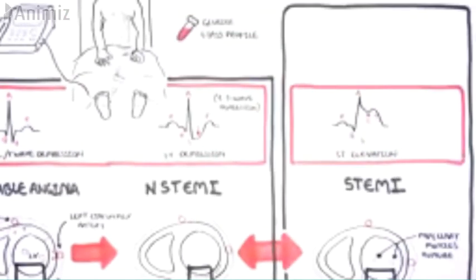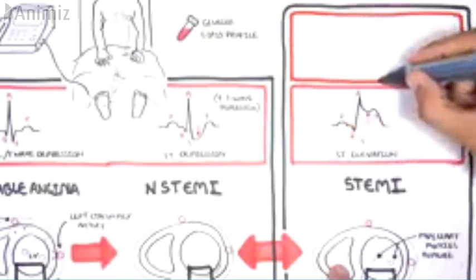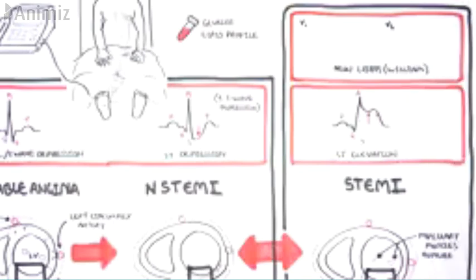With a transmural infarction, it is very important to also look for ECG findings which suggest a new left bundle branch block. To find a left bundle branch block, just remember the name William. The L in William suggests a left sort of bundle branch. The W and M of William tells you what features to look at: leads V1 and lead V6 on the ECG.